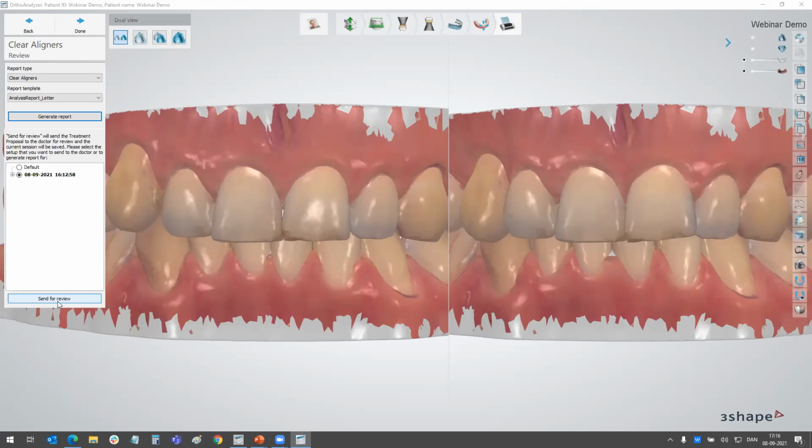So it's actually a bit more about getting the deep interproximal pockets, and that will also be like that in the real world. In splints, you will block it out if you have incisors that are flared out, but for aligners, you won't. You actually want the aligner to engage the part of the crown that is on the buccal side. So yes or no, depending on which kind of wax it is we are going to use.